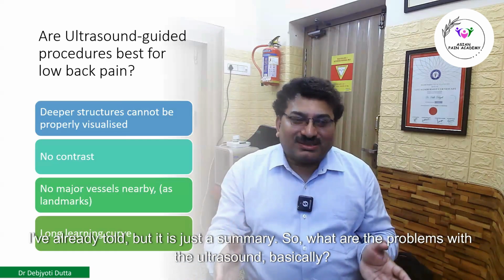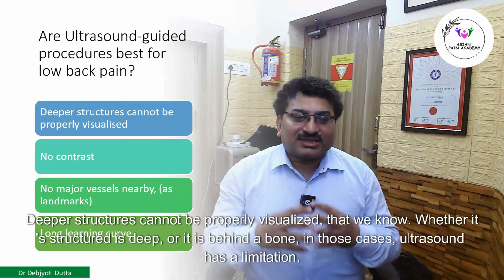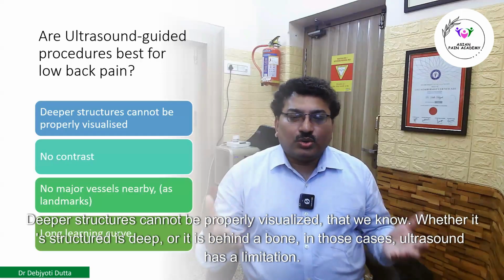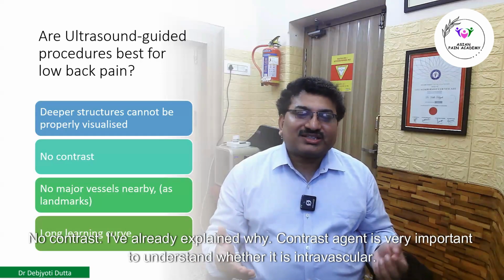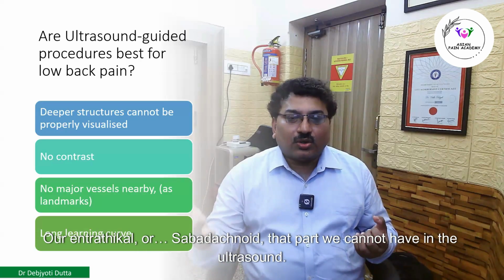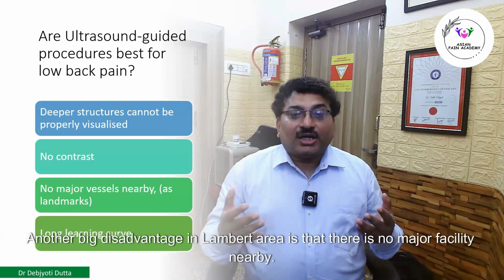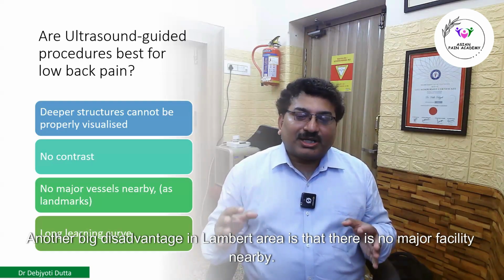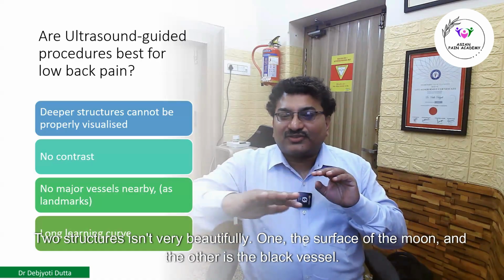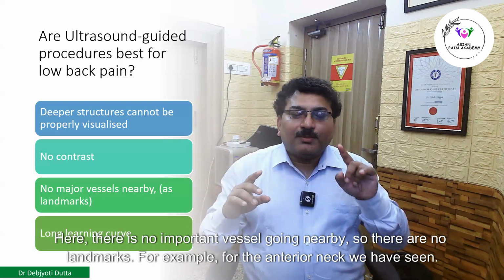So what are the problems with ultrasound? Basically, deeper structures cannot be properly visualized, that we know. Whether a structure is deep or behind a bone, in those cases ultrasound has a limitation. No contrast. I have already explained why. A contrast agent is very important to understand whether it is intravascular or intrathecal or subarachnoid. That part we cannot have in ultrasound. Another big disadvantage in the lumbar area is that there is no major vessel nearby. In ultrasound, two structures are seen very beautifully: one, the surface of the bone, and the other, the blood vessel. Here there is no important vessel going nearby, so there are no landmarks.